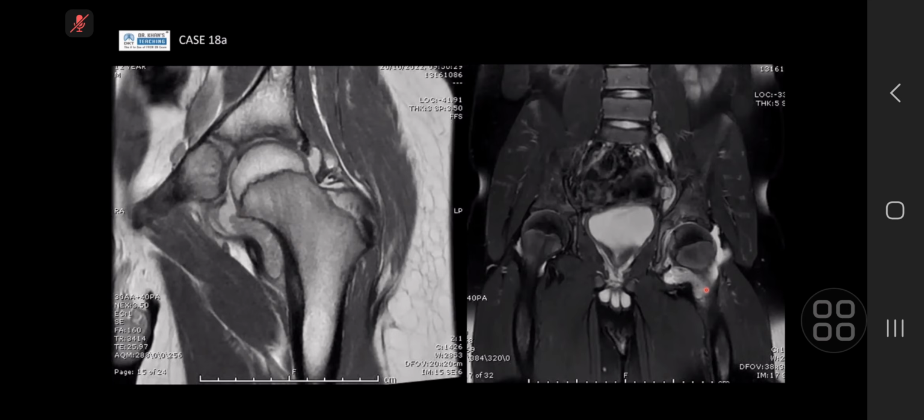The interesting thing here is there's not much in the way of marrow edema, and if this was, of course, correlate with clinical history, although sometimes it can be hard because, as I said, systemic JIA can have fever and raised ESR, CRP and so on. But septic arthritis is going to be really painful, whereas often with an acute flare of JIA, juvenile inflammatory arthritis, people can still carry on. They are not in excruciating pain.